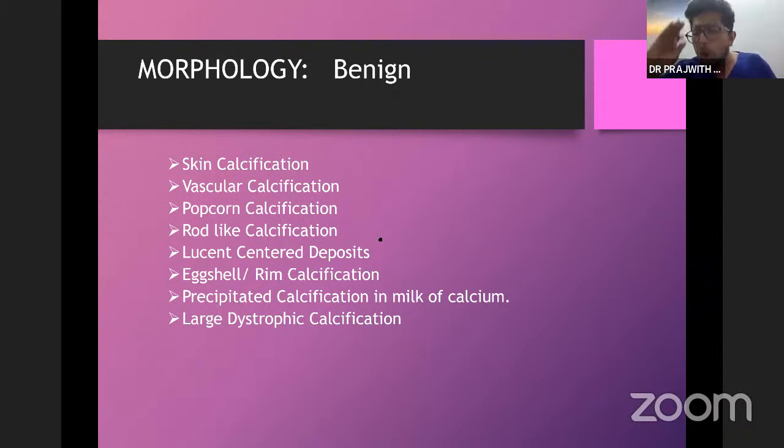A very obvious calcification in a mammogram, a macrocalcification, is benign. Something that is easily seen is benign. Something that is very difficult to see, very fine, minute, tiny, has more chance of malignancy. Some are in between, slightly bigger but hazy. These come in the intermediate category. Very simple division.